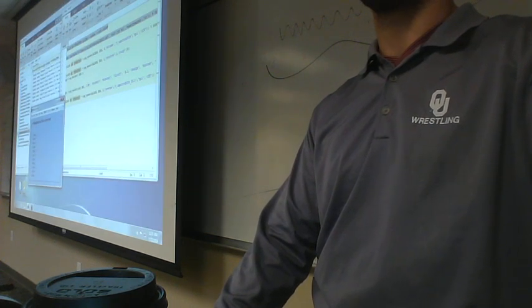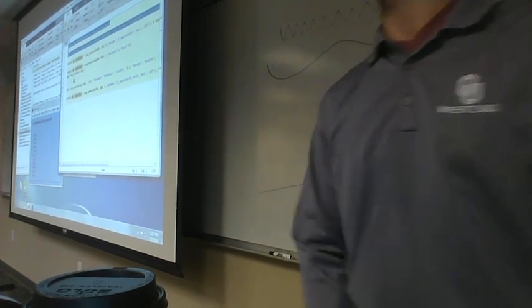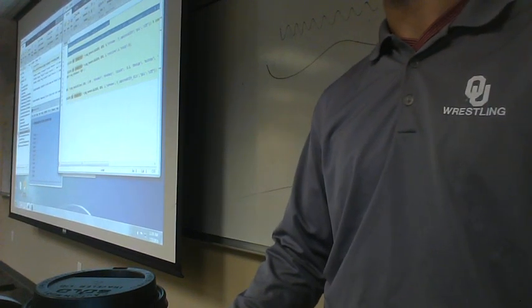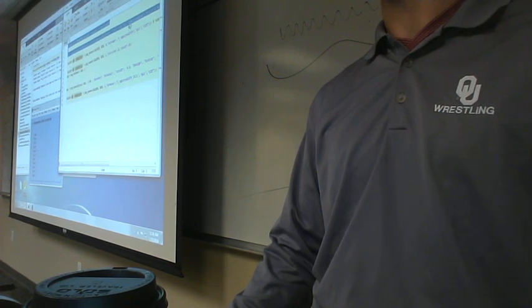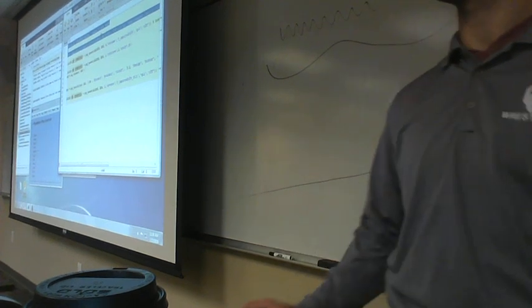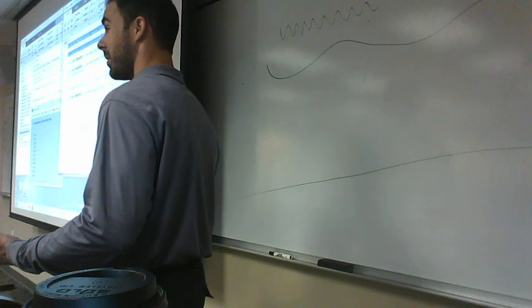Notice that I didn't type EEG Lab in, did I? It's already typed in here, and it automatically brought up our GUI, and then I didn't have to load the data in because it's already doing that. See all the steps it saved me? It's pretty nice, right?